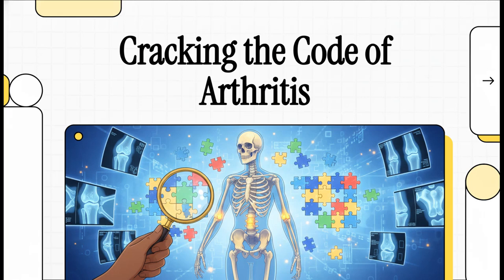When you hear the word arthritis, you probably think it's just one thing, right? But really, it's this huge, complicated puzzle. So today, we're going to crack that code. We're going to look over the shoulder of a radiologist and see how they can take a simple x-ray and just unravel this whole complex story that's hidden inside our bones.